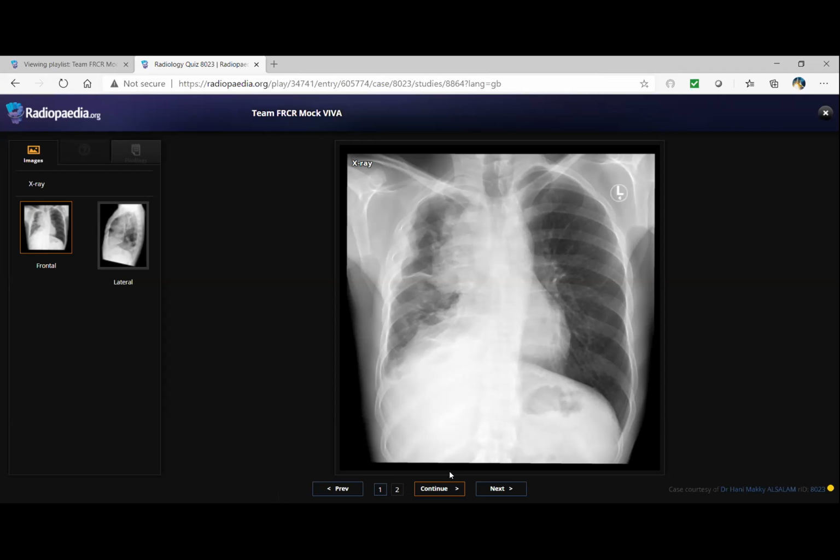I can also see some pleural thickening with a nodular appearance on the right lateral chest wall. And I think there is some pleural thickening involving the mediastinal pleura also. So there is abnormality of the right side of the mediastinum with lobular appearance of the lateral margins, and there is some mass effect upon the trachea also.